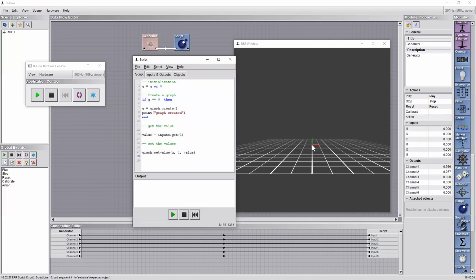You just want, and you notice in the beginning that you want this in a specific area in the VR. So you need to change the position, the width, give it a title, give it a label, etc. All right. So everything has its own nice little code here. So for instance, you can set the position, okay, and this is the graph, and then give it the values that you like. Let's say you want to be around y just 5 meter upward, and then -4, right?